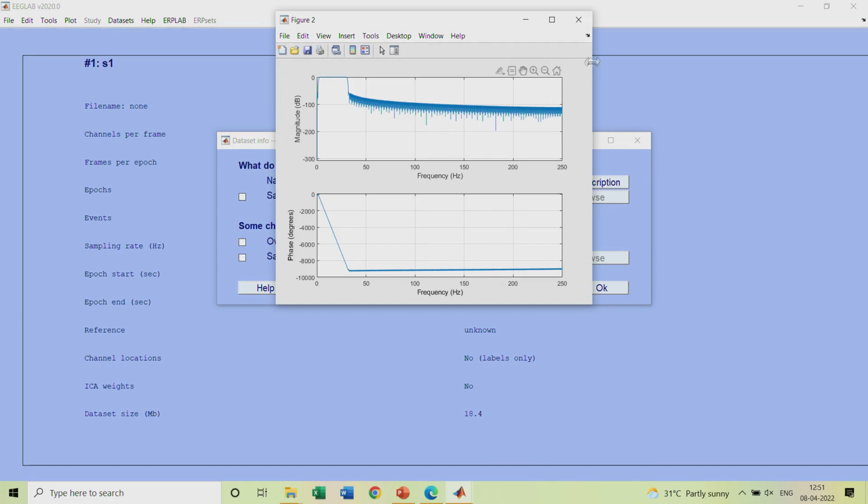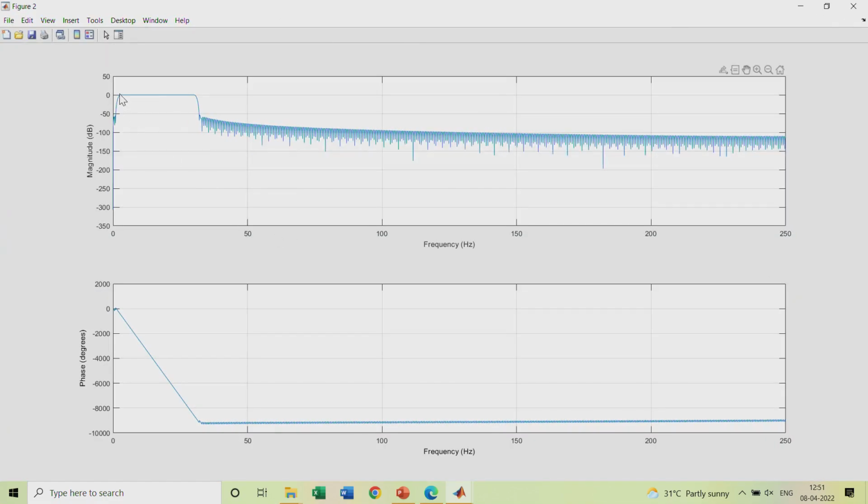You can see first, it shows your magnitude is 0. Now we want to pass this frequency. Why is it 0? This is in dB, decibel, so log 1 is 0. That's why, but it allows all these frequencies. Now till which point does it allow? If you want to see, you can put an indicator here and check. See, till 30 it is showing some value. If you go above, see, till 29 it's 0.007, so it's almost allowing 29 to 31.